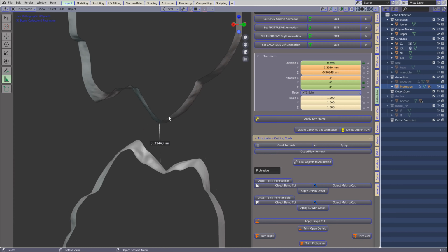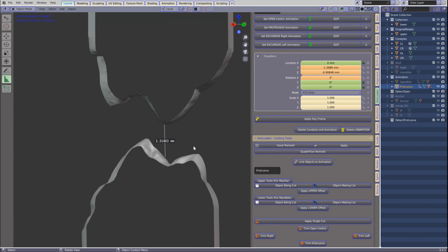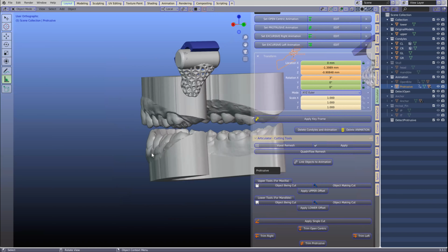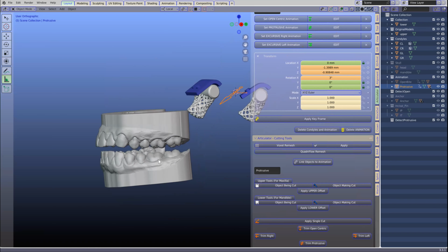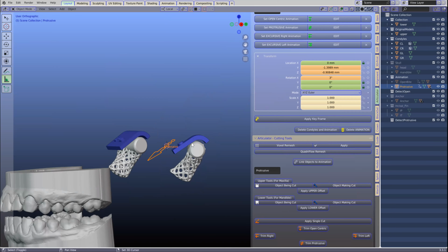I think more or less, because the cases I worked on are 3 and then 1.5, 1.75, that kind of range. Okay, so we'll just keep this at 3 degrees for this example. So we've set it forward.